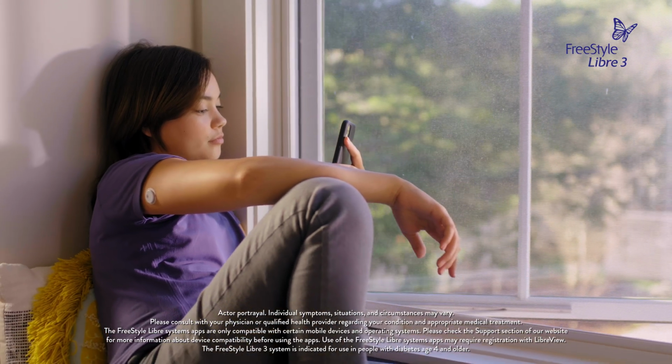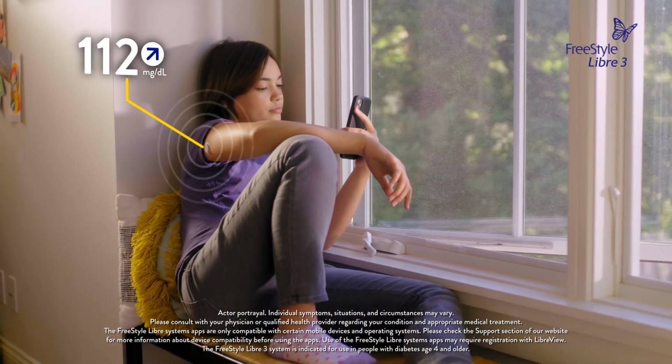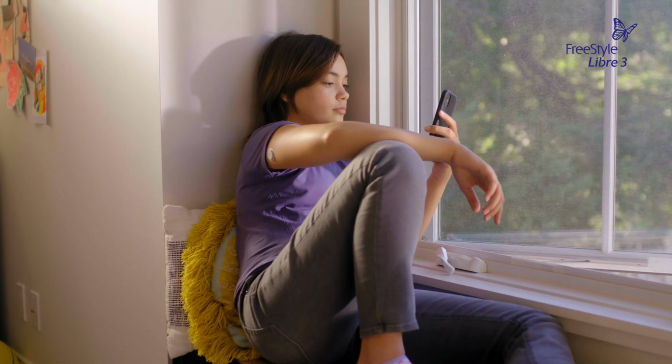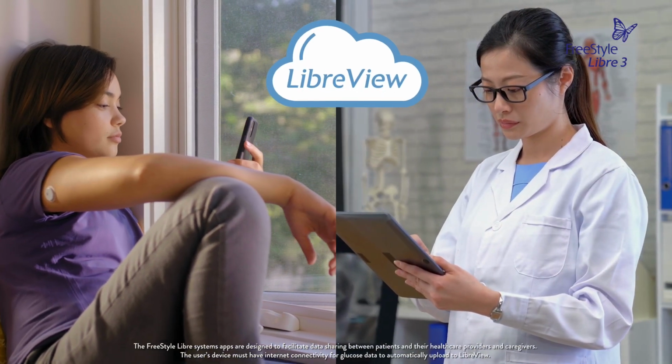One of the great things about my daughter's FreeStyle Libre 3 system is how much glucose information she has right at her fingertips, updated every minute on her smartphone. And she has a LibreView account, so her glucose data is automatically sent to her doctor between visits.